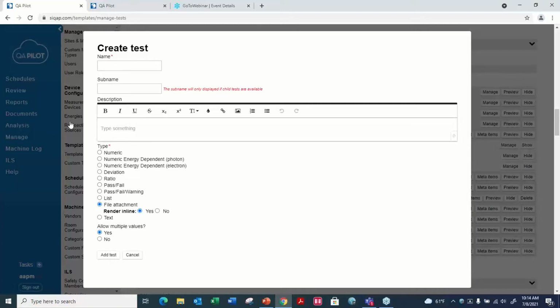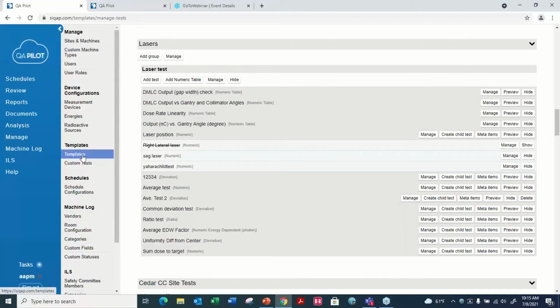You can create a general overall one, so it's standardized across Linacs and sites within your organization, and then you can customize those even further based on individual machines or technology that you're using, or accessories to your Linacs that are being used. So a lot of standardization and customization, because we want to optimize your time and optimize your workflows within the clinic. And of course, all of these are managed according to your workflows via our templates.